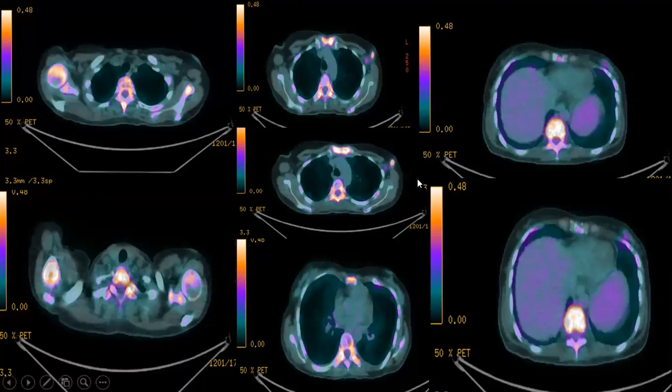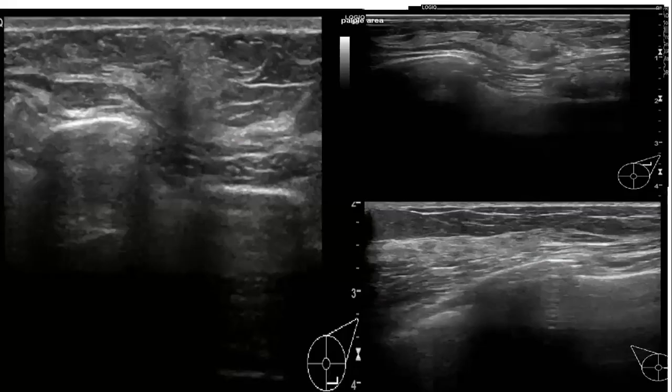And if you look here, this is the bone lesions, and axillary lymph node, it was metastatic. And if you look here, the same locations, and the report of the PET is the left breast is the primary site, with metastatic axillary lymph node, and the patient received treatment. And this is for 2 years, and up to date, I understand that the patient is okay, and she has a good response to the breast cancer treatment.